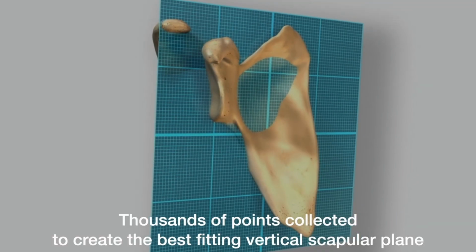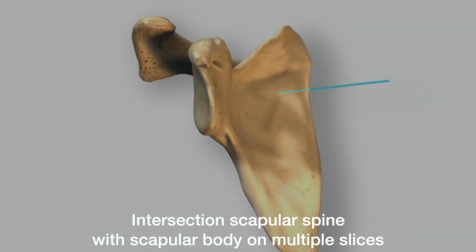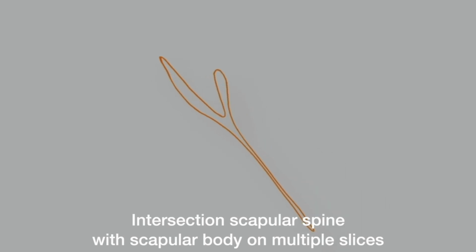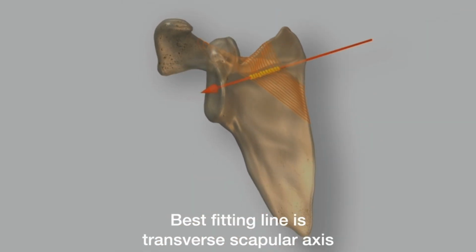Next, BluePrint will automatically identify in multiple slices where is the intersection between the body of the scapula and the spine of the scapula. And by connecting those different dots at the intersection between the scapular spine and the scapular body, we can then trace what we will call the transverse scapular axis.